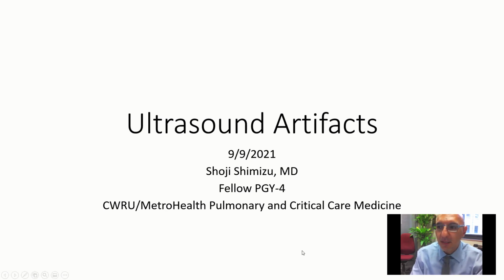So if something doesn't look right, the answer is probably not to increase the gain, but rather to dim the room and decrease the gain. Of course, machine processing and proprietary software algorithms can change the way the picture looks, and might inadvertently cause an artifact to show up more than you would like.